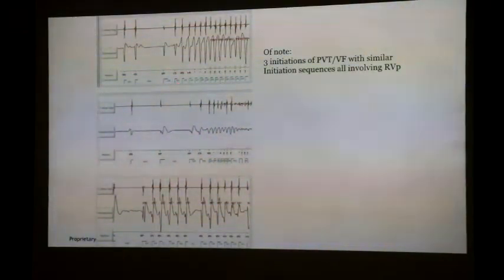Well, it's about how his VT or VF starts. His VF starts every single time with a ventricular pacing pulse. Every episode this man had was initiated by V pacing. Now that could be a statistical fluke, because he does pace 26% of the time, but every episode, and it's polymorphic and horrible. Normally primary prevention patients don't have polymorphic VT or VF. They have monomorphic VT. To go straight into VF like this is reasonably unusual. So this is V-pace induced arrhythmias.